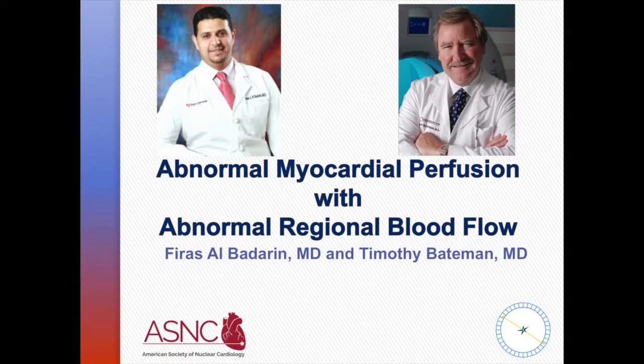Dr. Gary Heller, as chairman of the PET task force within the American Society of Nuclear Cardiology, has asked us to prepare a case of an abnormal myocardial perfusion PET study in a patient who has abnormal regional myocardial blood flow, so that we can discuss the meaning of this in relationship to PET versus SPECT perfusion imaging.